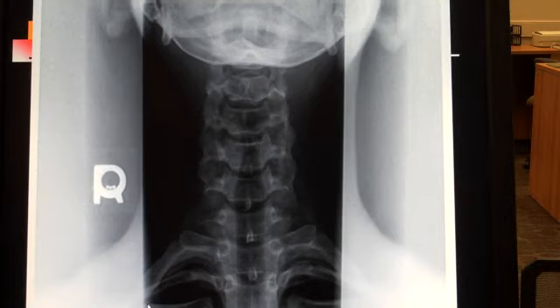But this structure that is coming straight in, right here's the top of it, right here's the medial aspect of it, that is going to be the clavicle. So the clavicle is right here. We have 1, 2, usually 3 ribs, either above or third rib superimposing. I have seen as many as 3 ribs above the clavicle with the 4th rib superimposing.